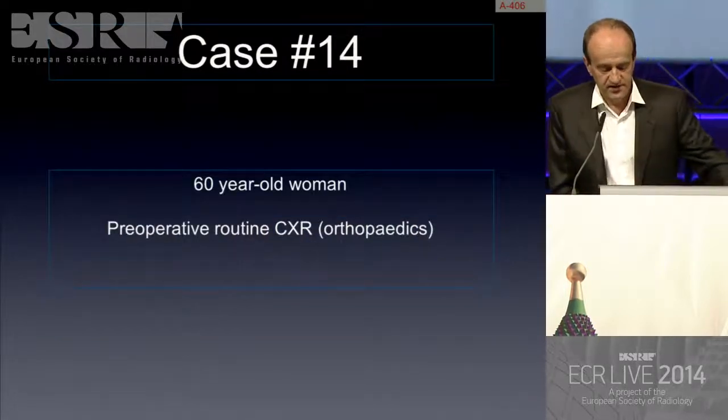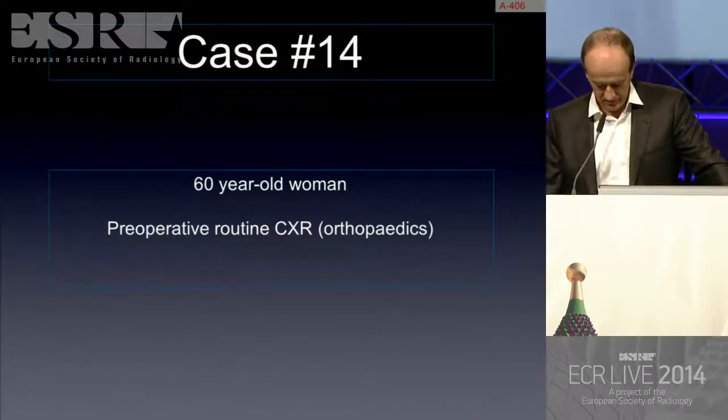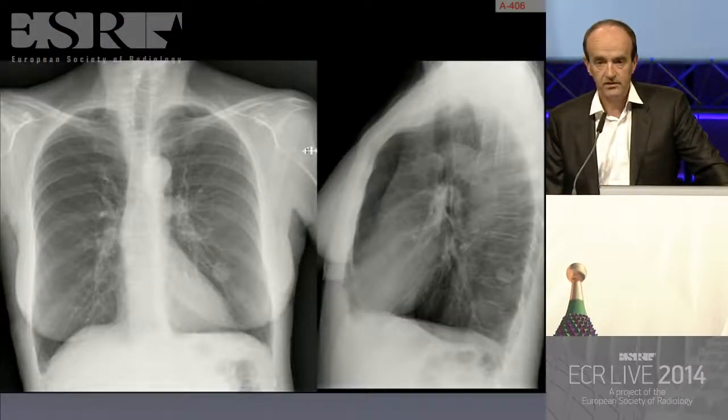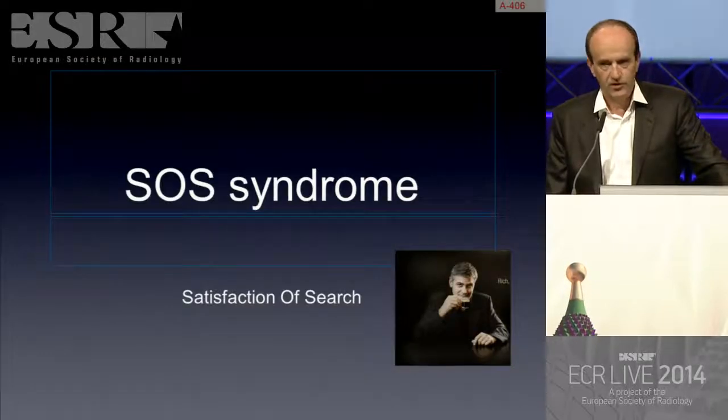Next patient is a 60-year-old woman. She has a pre-operative routine chest radiograph. Here is the examination. Of course, remember George.